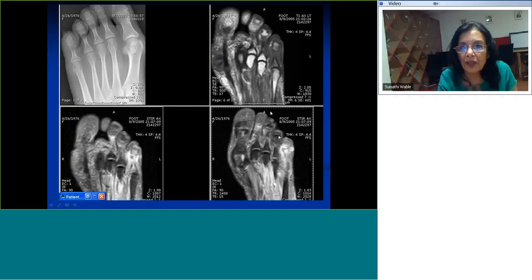Moving on to other etiologies, other pathologies in the bone, like we said, osteomyelitis, specifically in diabetic foot. MRI is an indication to image patients with suspected osteomyelitis. Typically, you look for low signal on T1 weighted images and marrow edema on fluid sensitive sequences.